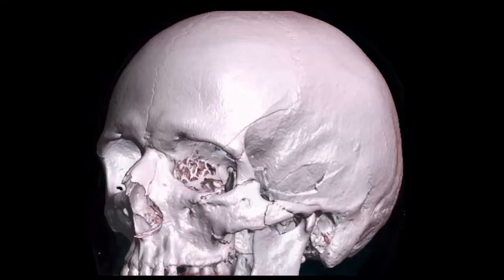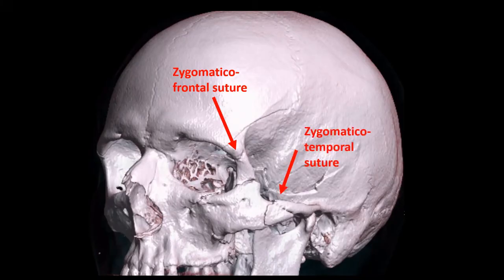And if we look at the three-dimensional reconstructions of this same patient, we see fractures centered along the zygomatico-frontal suture, along the zygomatico-temporal suture, and the zygomatico-maxillary suture.